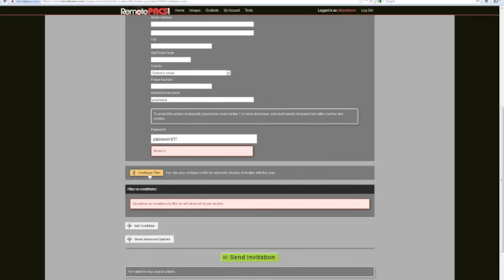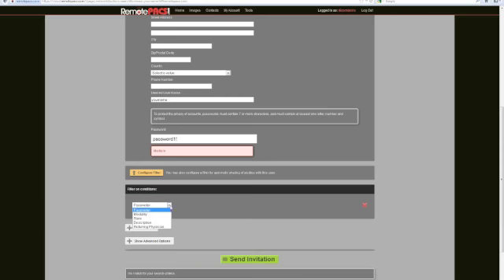So I click on this configure filter button here, and specifying how we determine what studies are shared is pretty easy. We click on add condition. And by default, there are 4 different ways we can restrict them to just doing certain studies. One is by modality. So we can select, for example, CT.